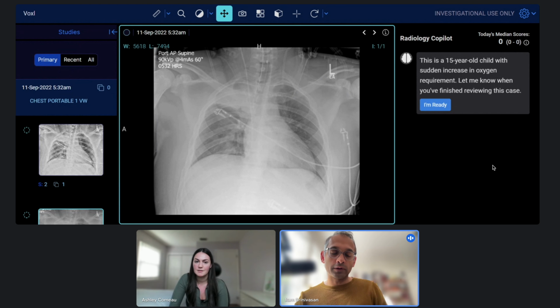How do you look for an over-penetrated film specifically? So I would look at the lung spaces, see if there's any blacked out areas that you can't get out of when you're windowing and leveling. Okay, and for under-penetrated, what do you look for? I look at the intervertebral disc space. So if it kind of looks like a blob of white, then it's under-penetrated.